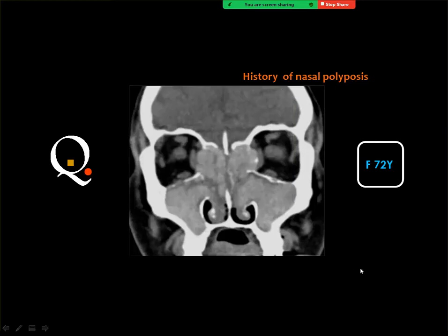This is fungal sinusitis because of the hyperdensities inside the paranasal sinuses, and fungal usually complicates the sinonasal polyposis type of pansinusitis because this is a chronic illness, and frequently it is complicated by superadded fungal infection.